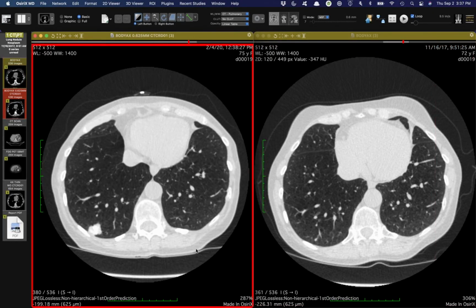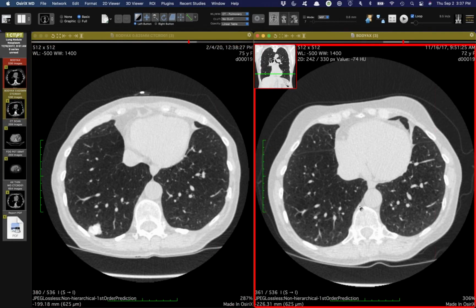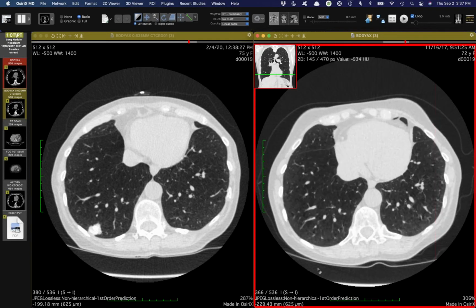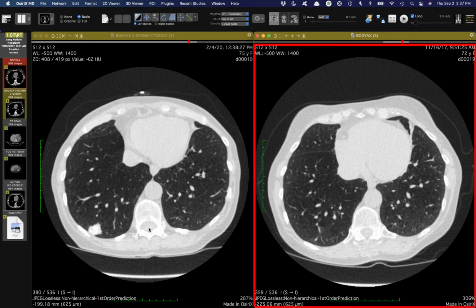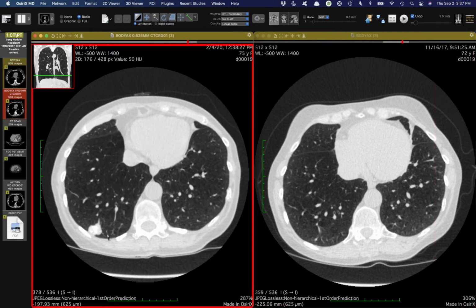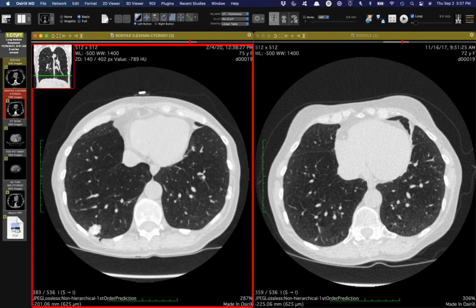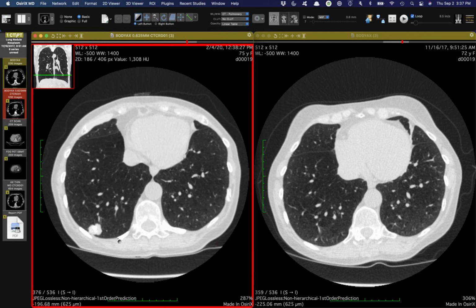Besides the calcification, it's sort of blotchy, with lower attenuation in it. Yeah. Well, fortunately, it made it easier that there was a prior from 2.5 years before, and there was nothing there. I'm discounting this little thing. Maybe that's the start of what this is, but this was all new. It was not a treated cancer at this point. This was biopsied, and it actually turned out to be small cell carcinoma.